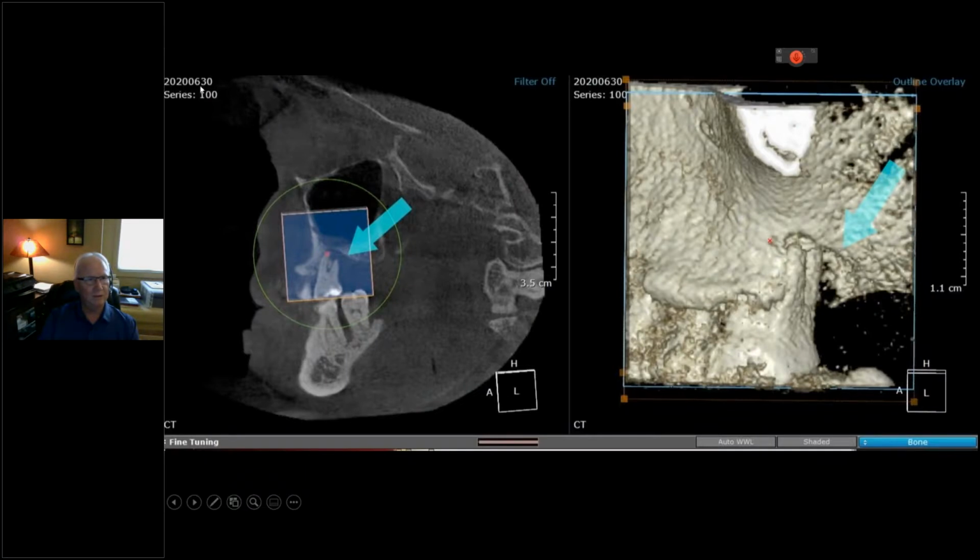And then just today, I reported a case that I received yesterday, and I left the date in for you. This was 6/30/2020, and this was someone who was apparently, quote, diagnosed by a medical intuitive, and some of you know that term. And they were looking for, quote, cavitations. Well, this gentleman had a lot more going on than cavitations. A lot of his pain and problems could be explained by plain old dental disease.